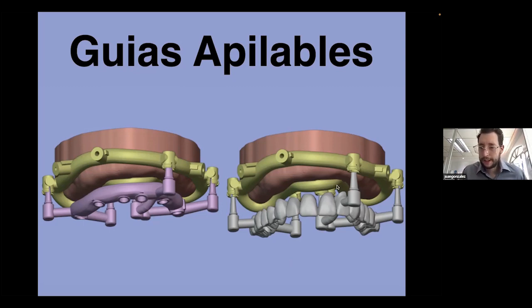So the joint between both the upper and lower parts is this. I don't know if you can see my mouse. I hope so. These are small cones, and these have a small step in there. So when you insert that part, it will click in place, and you will have a very secure guide that you can interchange with different elements, right? That's the main concept of this stackable guide.